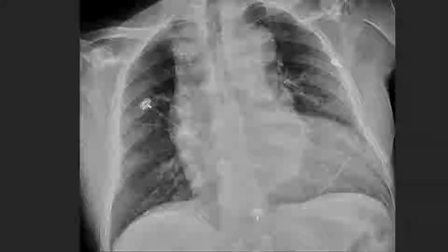Now let's contrast these normal findings to some diseased aortas by applying some of the rules we just learned. In this case, we can see that the ascending aorta extends beyond the outer edge of the right atrium. In addition, the aortic knob appears enlarged, less circular, and less smooth than typically seen. The descending thoracic aortic stripe is also quite lateral to the thoracic spine and has a very undulating course. These findings would suggest the presence of an aortic aneurysm.